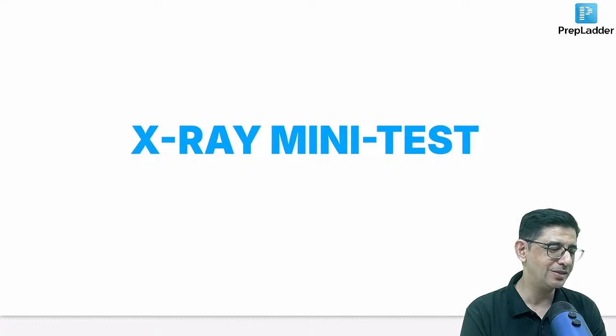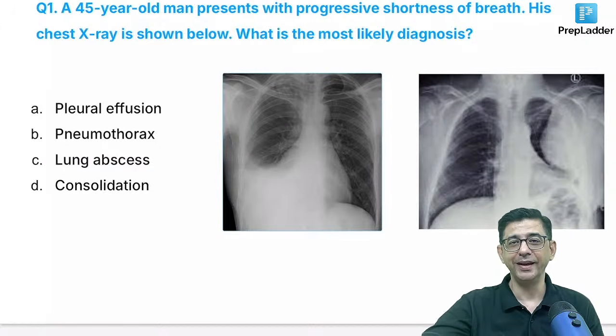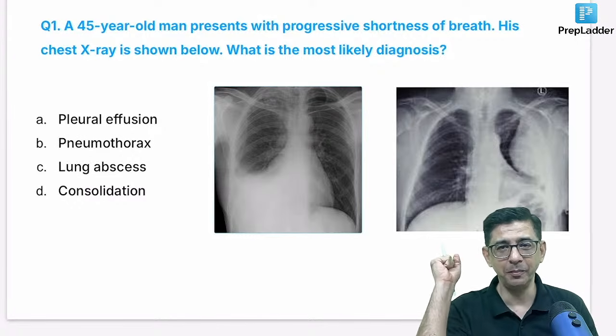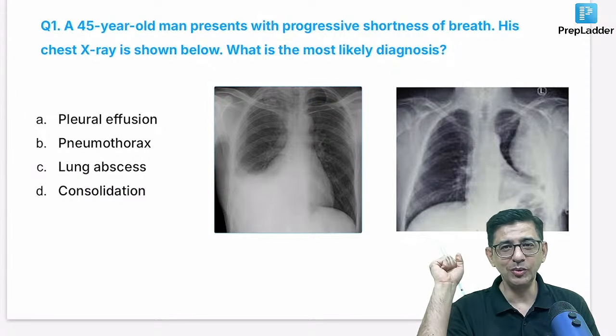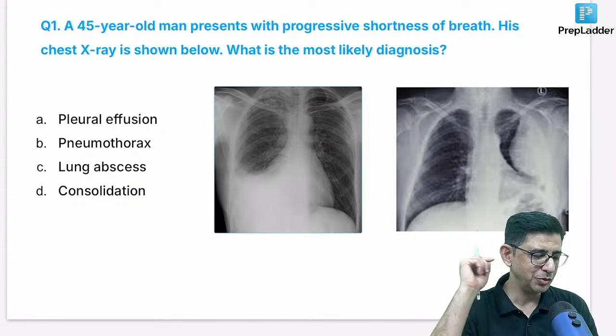Today's the time for those quick x-rays, though nowadays everything in radiology is more focused on investigations like an MRI, but still it's the good old x-ray which will help you in identifying the common problems in the patient.